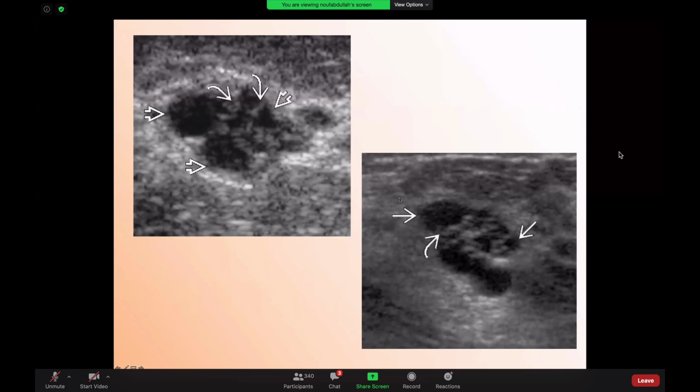People who did breast imaging might question, what's the difference between this and a clustered cyst? Sometimes it's very difficult, guys. A clustered cyst is when you have tiny cystic areas within this. You have very thin internal septation. You don't see vascularity within it. Then this is a clustered cyst. A clustered cyst is mentioned in the BI-RADS lexicon, and it's usually BI-RADS 3 or BI-RADS 2.